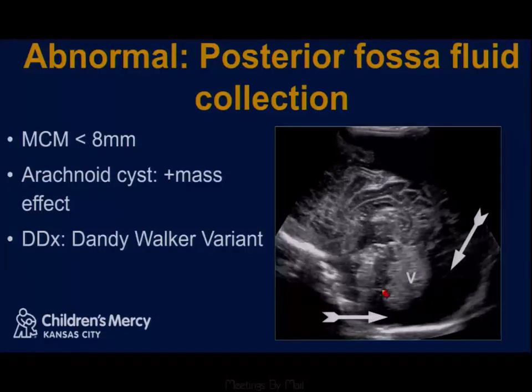Finally, look very carefully at your cerebellar vermis if you have fluid back here, because if there's any uplifting of the vermis, or the vermis is only partially present or is completely gone, you really have to question whether you have a Dandy-Walker variant, such as a Blake pouch cyst or a full-on Dandy-Walker malformation. And again, MRI is your friend here for correlative imaging.